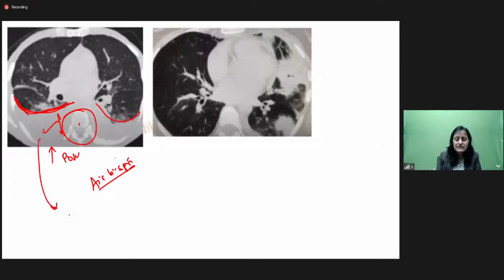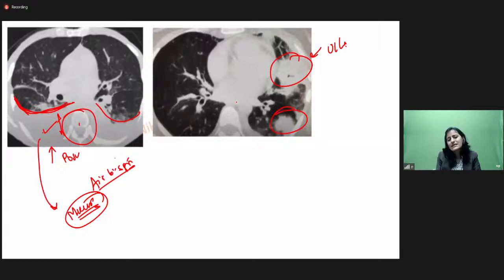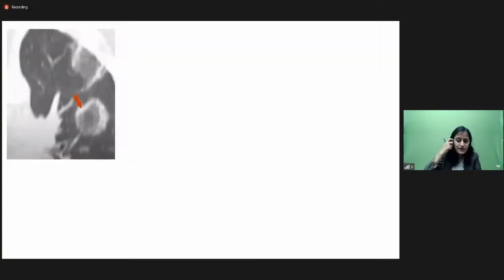If present, it has been found to be associated with mucormycosis. So if there is pleural effusion, but you should see other parenchymal changes as well. Right? And these are the areas of consolidation. Especially when you see that the pathology is unilateral, then it is less likely to be COVID. COVID is more likely bilateral. Unilateral goes into your CO-RADS 4. It's not CO-RADS 5.